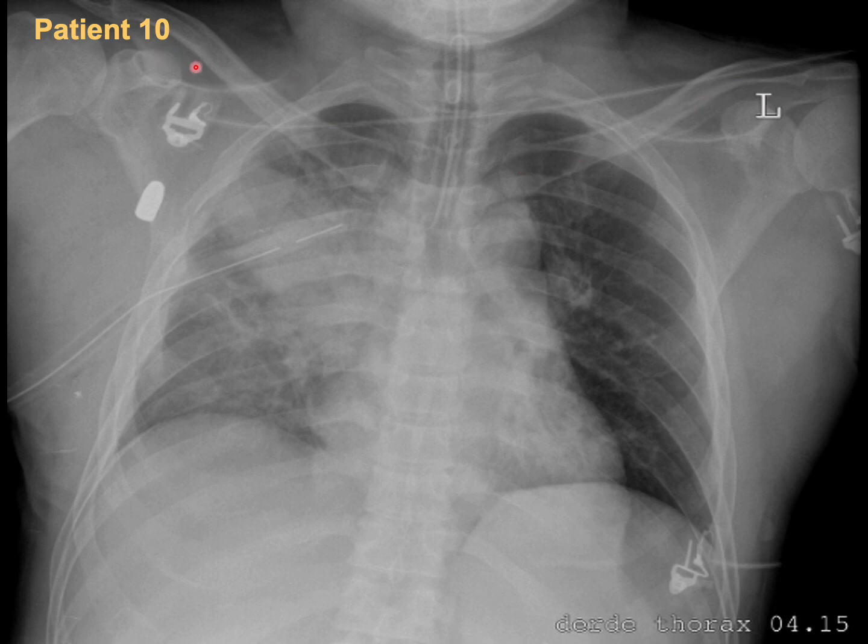Bones. Okay. But when you look here, you will find that this patient has a rib fracture here. Everything else: tube, electrodes, lines, intercostal chest tube, and a bullet. So the patient has a gunshot wound on the right hemothorax with rib fracture and contusion. After drainage, the bullet is still in place. Okay?